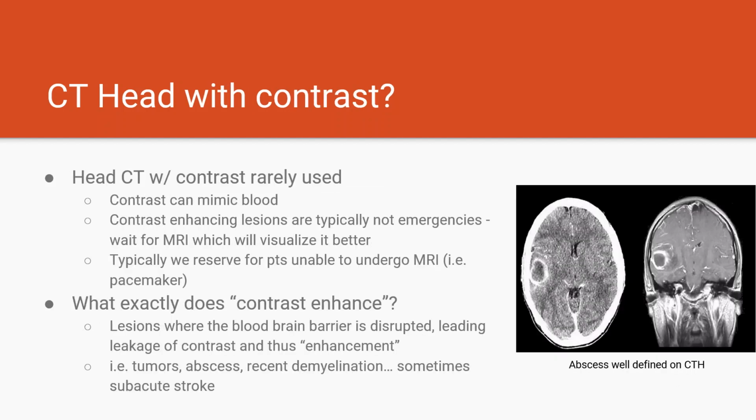If you notice in the last slide, I really focused that was a non-contrast head CT as a screening test of choice, and so you're wondering when we would order a CT head with contrast, then the answer is honestly almost never. This is for a couple reasons. As we'll talk about in a couple pictures, contrast can easily mimic blood, and since we're often using non-contrast head CT to first and foremost rule out blood, this kind of defeats the purpose.